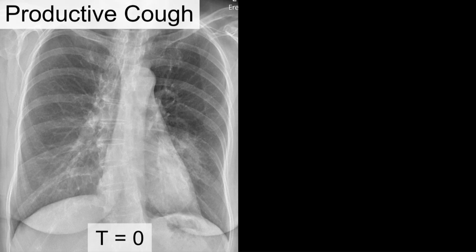All right, so last case is a patient with a productive cough. They presented, they really didn't have much in the way of fever, but a very productive cough. And they have this sort of nondescript opacity in the left lung.